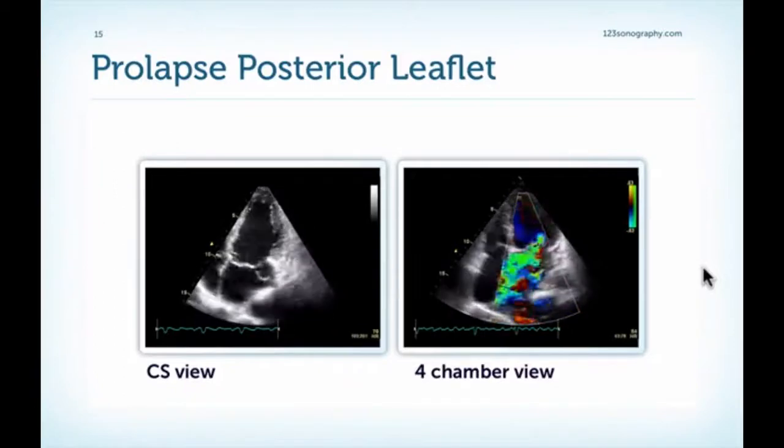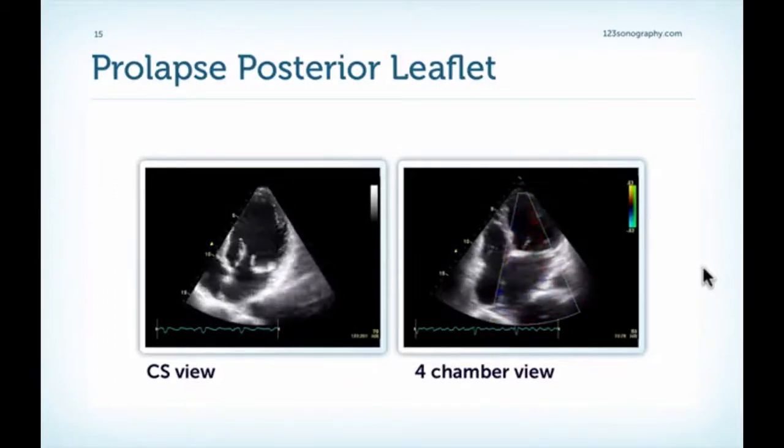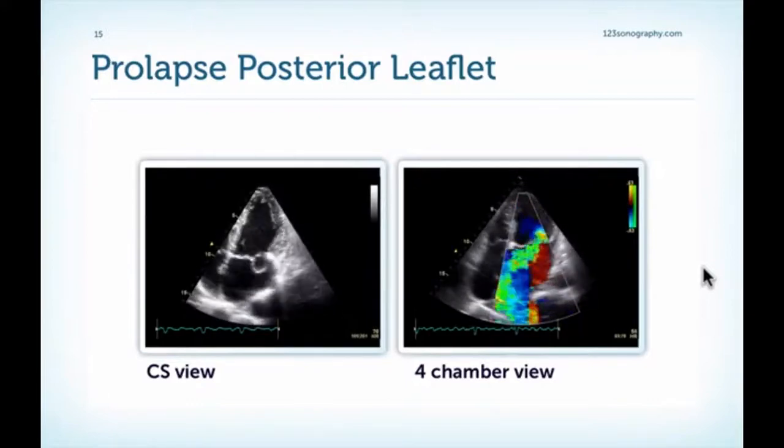How severe do you think regurgitation is? Well, I don't think you need PISA quantification here, and you probably do not need volumetric methods or anything else. Just look at it. It's severe. I'm sure you all agree.